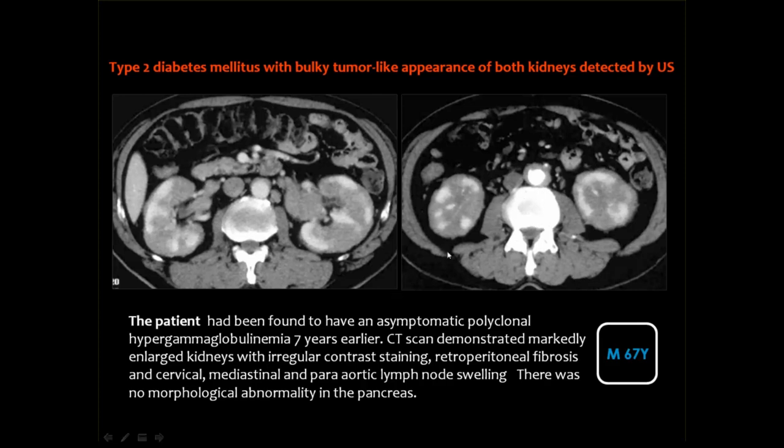Then one may ask, you have mentioned before that whenever the kidney is infiltrated by multiple non-enhancing lesions, this may point to the affection of the kidney by lymphoma. And that's true. If you try to differentiate between both on isolated imaging only, this is a very difficult situation because the lesions share many of the diagnostic criteria, like the patchy non-enhancing areas.